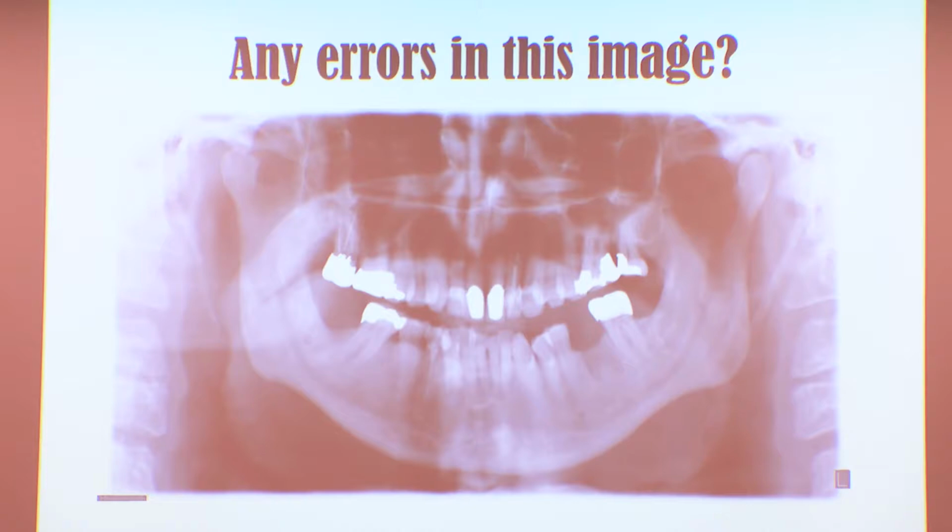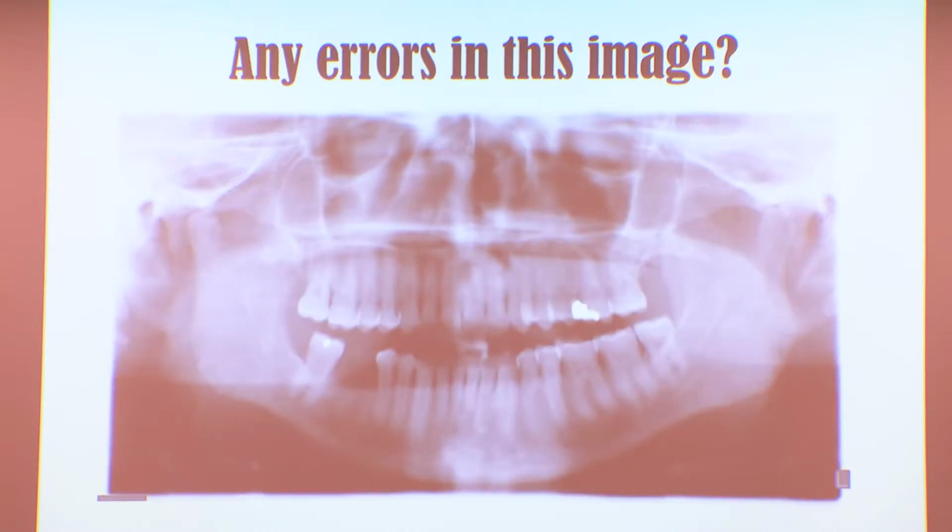So you can see that the face looks smaller than it should be. You can also start to see the spine coming into the image on the sides. This will sometimes happen if you have a really small patient, because there's less body to get into there. So then the spine will actually show up. Doesn't mean that you did anything wrong. But if you can look at the teeth, they just look really small. So you know that you have the patient too far anterior.